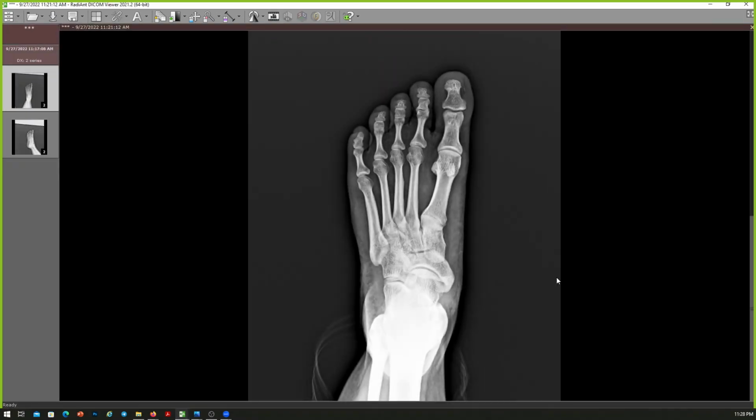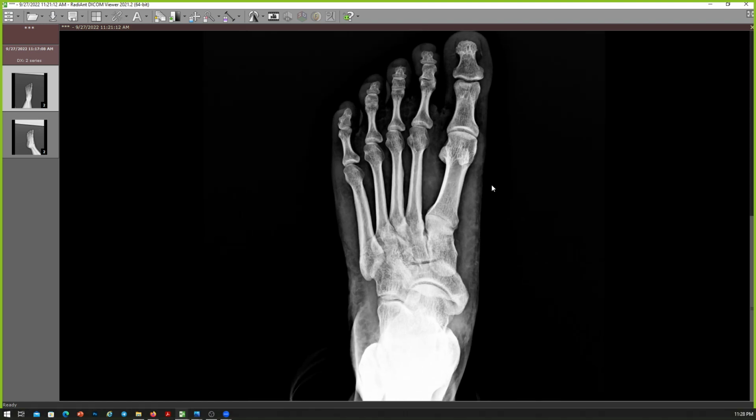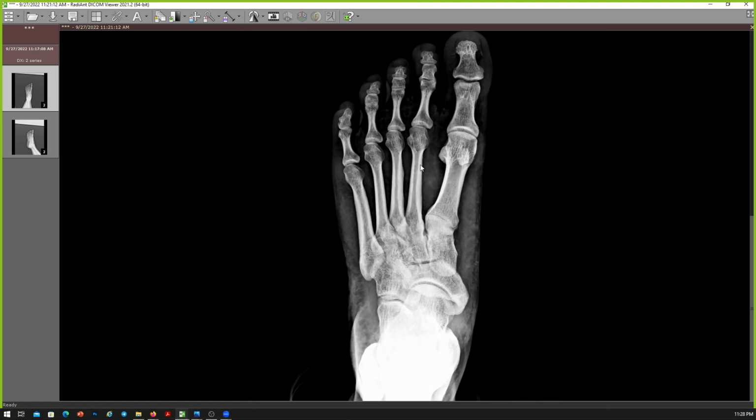Okay. Have a look at this case, please. Okay. So this is a frontal X-ray for a foot for a skeletally mature patient. Okay. First, I will trace the cortices of every bone I can see to check for any fractures. Okay, I can appreciate a focal fusiform-shaped area of solid periosteal reaction.